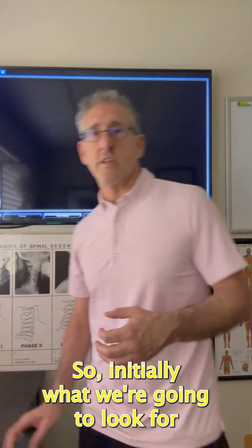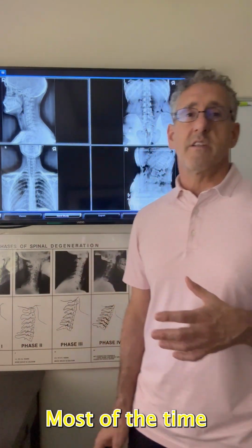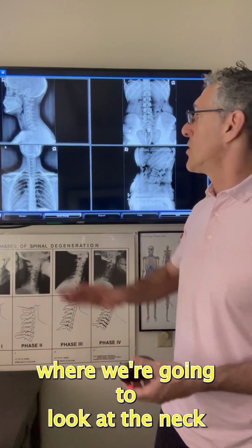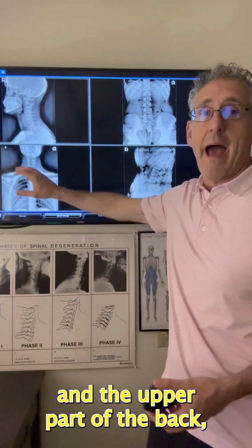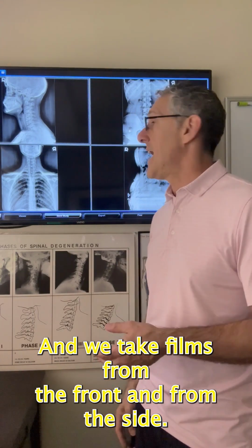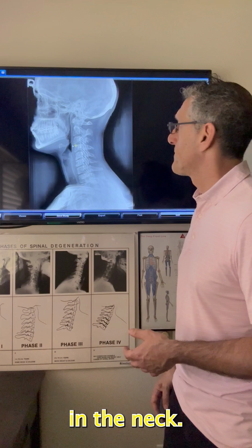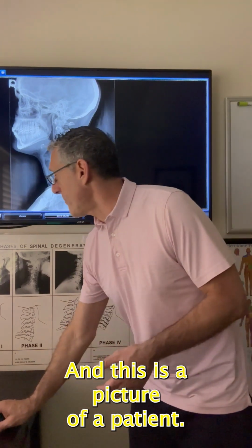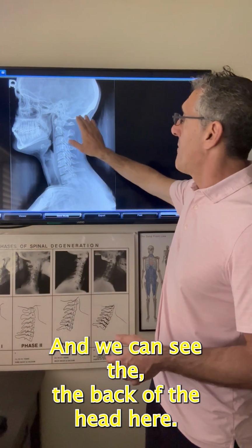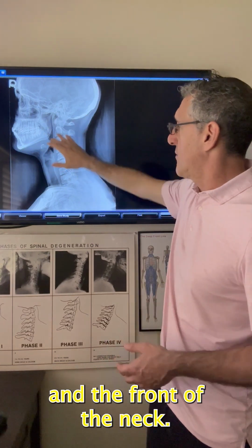So initially what we're going to look for are the type of films that we take. Most of the time we're taking films where we're going to look at the neck and the upper part of the back as well as the lower part of the back, and we take films from the front and from the side. We're going to start today by looking at a side picture in the neck, and this is a picture of a patient, and we can see the back of the head here. We can see the angle of the jaw. We can see the back of the neck and the front of the neck.